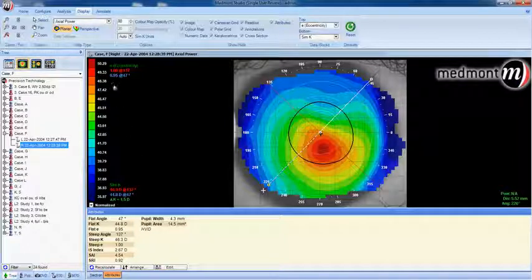And in review, if you have a scale range greater than 10 diopters, that would be considered abnormal. If you have an eccentricity value above 0.8, that would be considered abnormal. An IS value greater than 1.5, surface asymmetry greater than 1, and surface regularity greater than 0.8 would be indicative of an abnormal or possibly diseased eye.